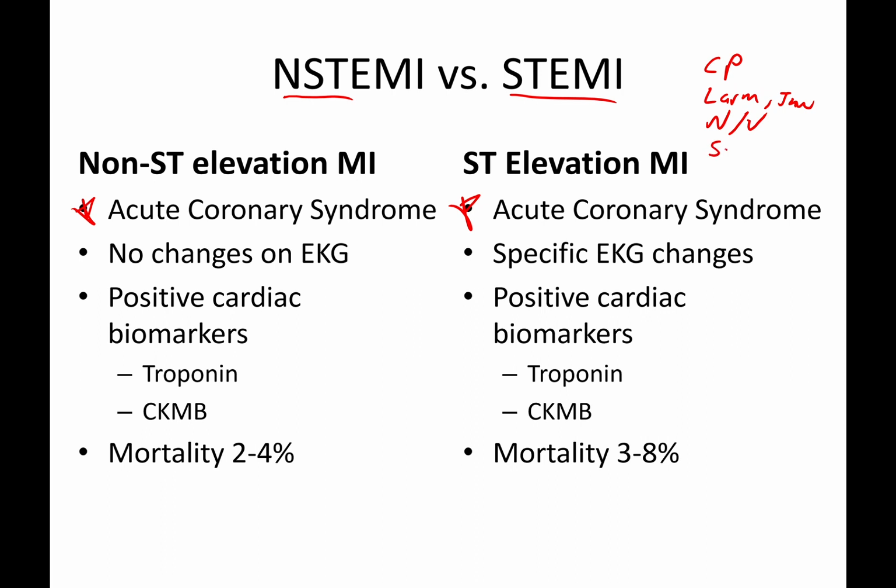You'll have the diaphoresis, things of that nature. It's gonna look the same whether it's a STEMI or a non-STEMI. And so at that point, that's why we work them up the same way. The only real big difference between them is that a non-STEMI doesn't have any changes on the EKG, whereas we'll see specific changes with a STEMI, particularly ST elevation.